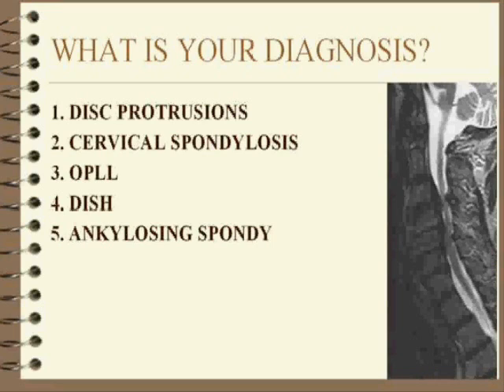And the answer is OPLL. Excellent. That is the correct choice. And I was ever so kind because I gave you the axial view. I'm sure the tests, first of all, they always show OPLL at all these tests. I have yet to see one that doesn't have it. It's one of these index cases. And they always withhold the axial.